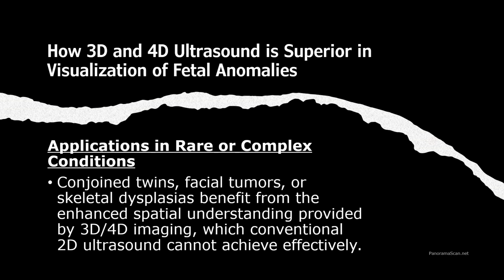In cases like conjoined twins, facial tumors, or skeletal dysplasias, 3D and 4D ultrasound significantly improves visualization, allowing for better assessment of anatomy and more precise planning.